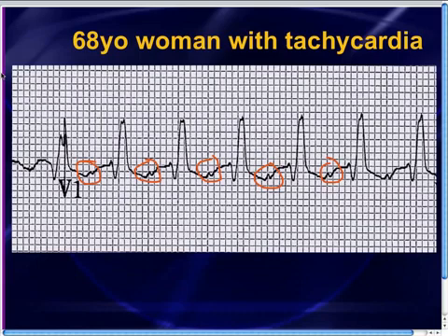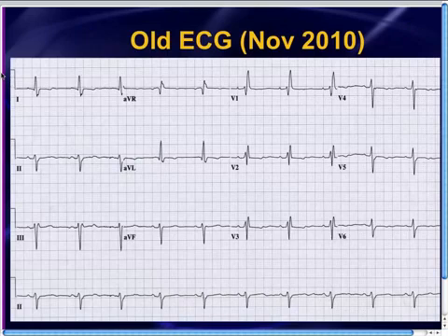In this particular case, the P-QRS complexes are very clearly regular, and there's kind of a long PR interval. And the pearl I'm going to give you here is that whenever you've got P waves that are stuck somewhere about halfway between the QRS complexes, think about flutter a little bit more.